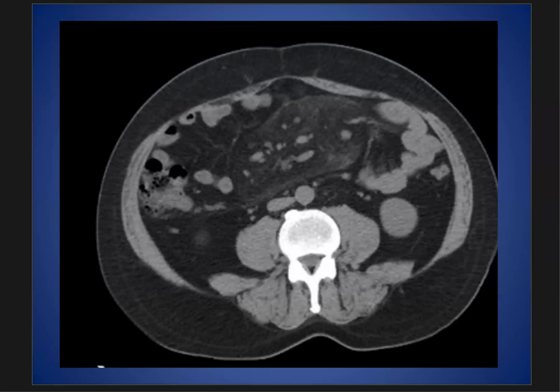So, recap, this is a case of sclerosing mesenteritis. It is a rare disease, with unclear inflammatory changes involving the mesenteric fat with some fibrosis, and the fat around the blood vessels is preserved. It is the fat ring sign or fat halo sign. The treatment is supportive, and it may be associated, as we said, with other conditions.